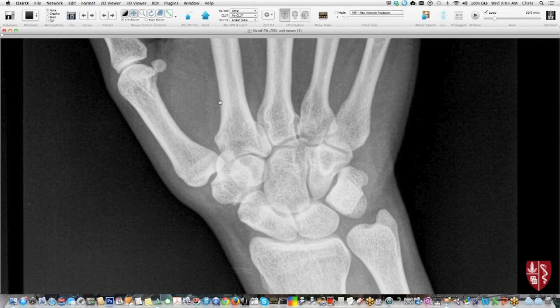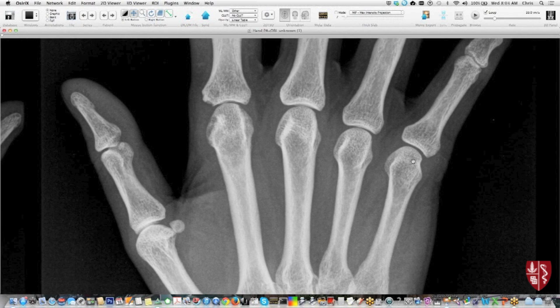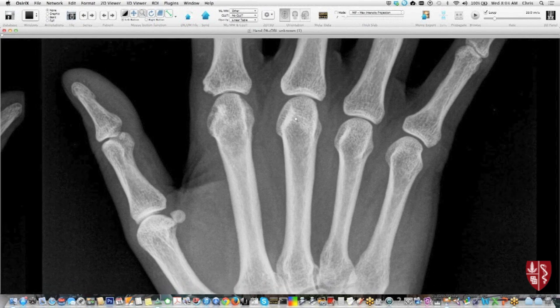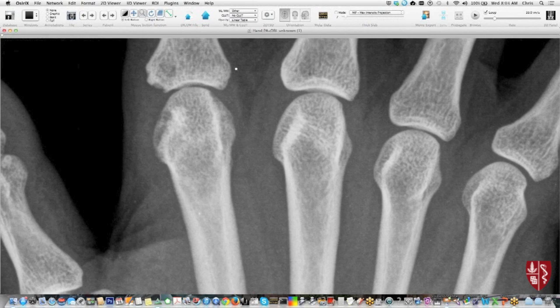And let's take a look at the carpal bones, looking good, intercarpal spaces, go down to the MCP joints here. These look fairly normal, right? Maybe a little bit narrow, but this doesn't look very normal. So if we look at that MCP, again, you should be able to follow cortical bone all the way around. And on this radial aspect, you see a little bite out of there.